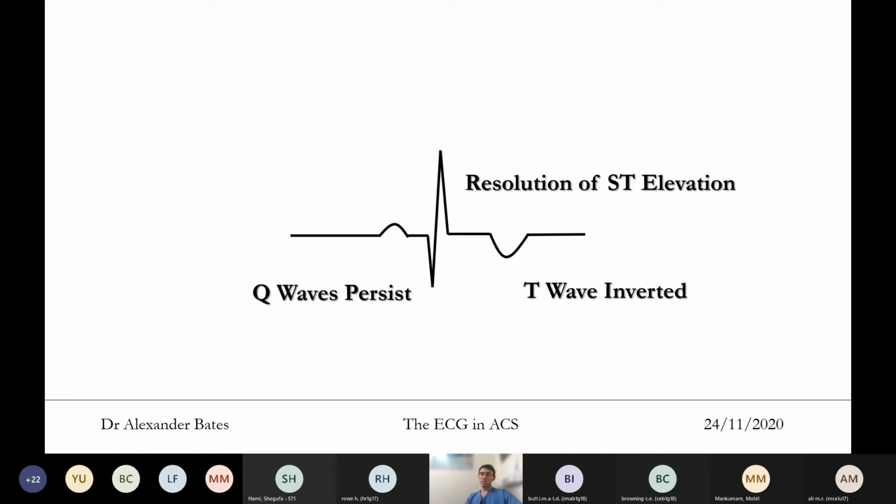You sometimes will see this ECG pattern in patients who said, a few days ago, I had some indigestion, some chest discomfort, felt a bit breathless, and I just kind of wanted to man up and didn't see the doctor about it. But now I feel really breathless and I've decided to come down, and you'll see something like this. And it's always quite disheartening because you know what happened 3 days ago and you know you could have done something more for that patient at that time, but now you're much more limited in what you can offer.